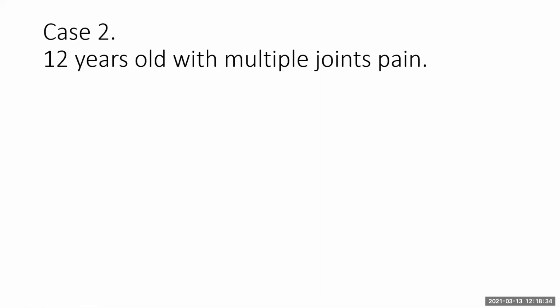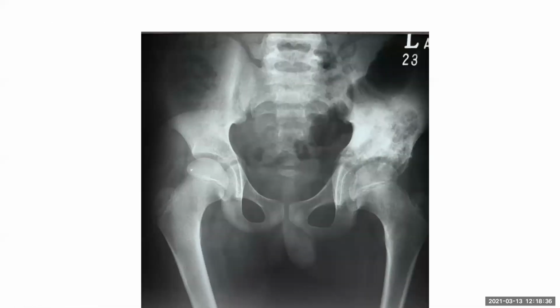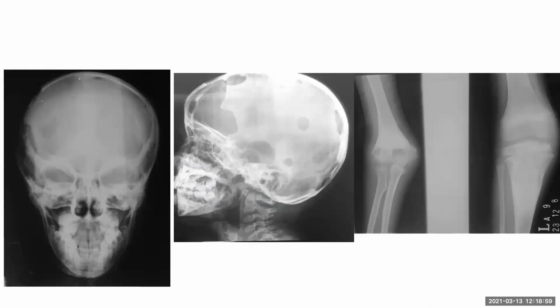Right, madam. Okay, multiple joint pains, as I told you, this was a large lesion. It is a mixed sclerotic and lucent lesion, all in the iliac bone and the acetabulum, not involving the head. So of course we rule out the possibility of septic arthritis. In multiple joints, you rightly asked for other images.